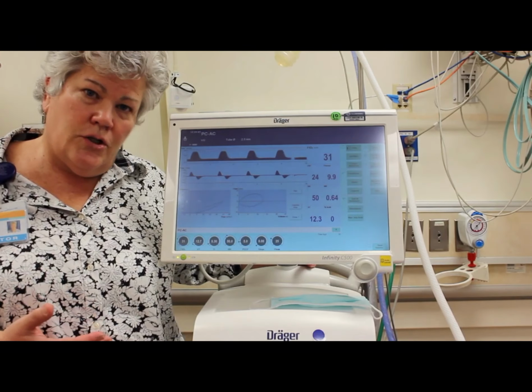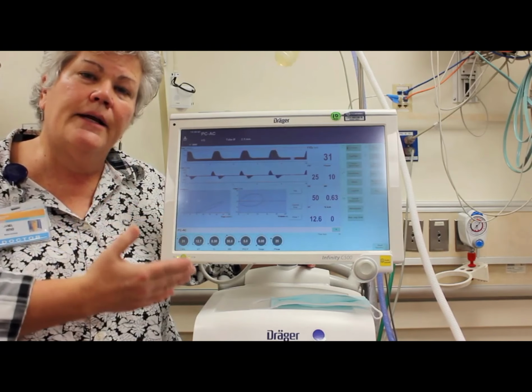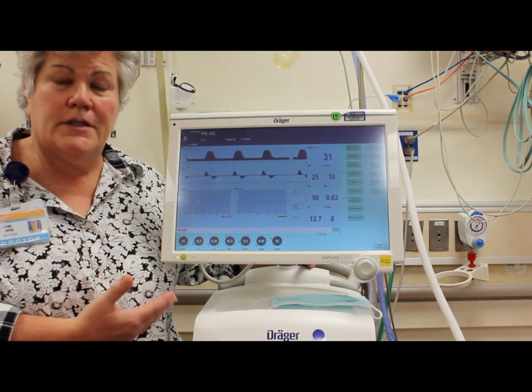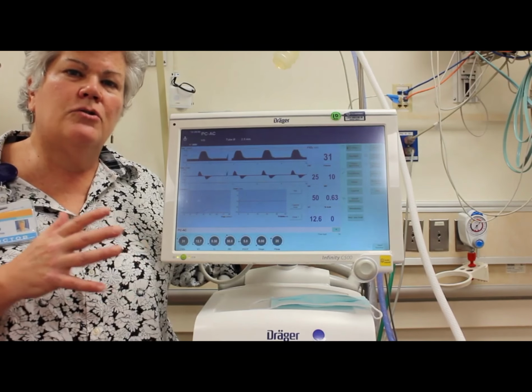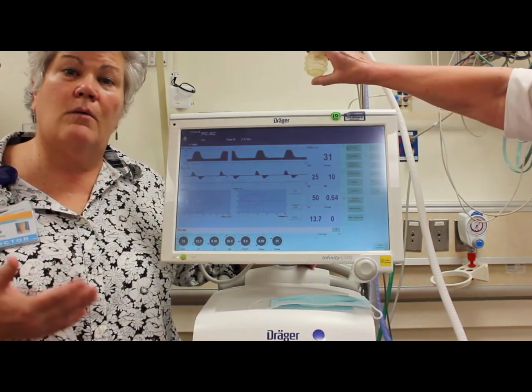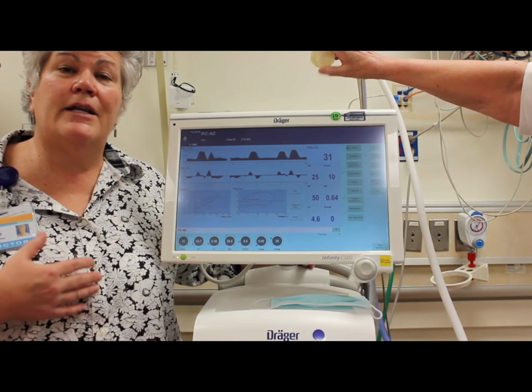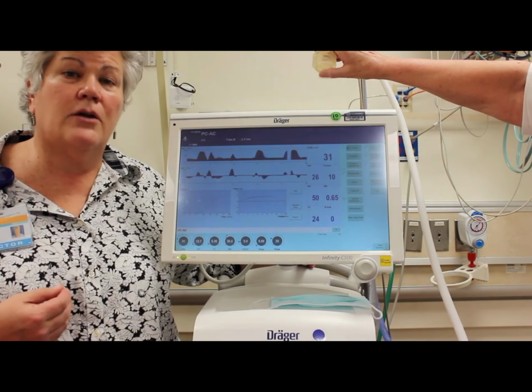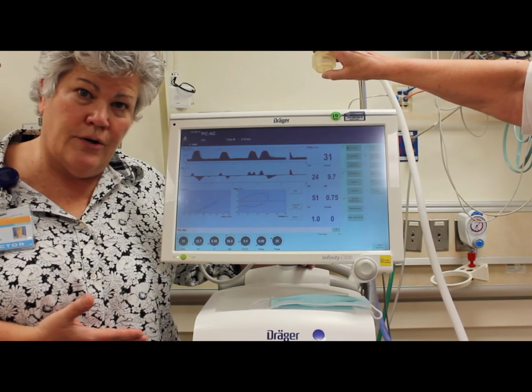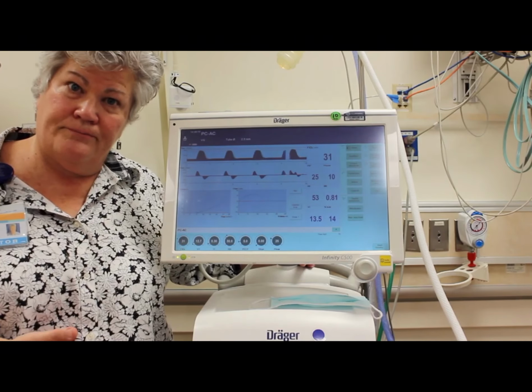If the compliance changes, for each breath, the PIP is exactly the same, 20, but the tidal volume can change. The tidal volume in the beginning could be our goal, 5 to 6 mLs. As the compliance changes, as we hit those pressures each time, the tidal volume may go up: 6 mLs, 8 mLs, 10 mLs per kilo, and that is overexpansion of the lung. So that can cause barotrauma. So we have gotten away from using pressure, and we're going to talk about now inflating the lung using volume.